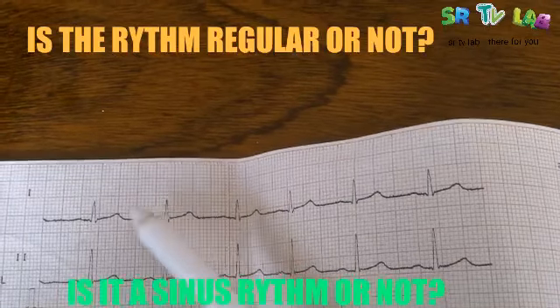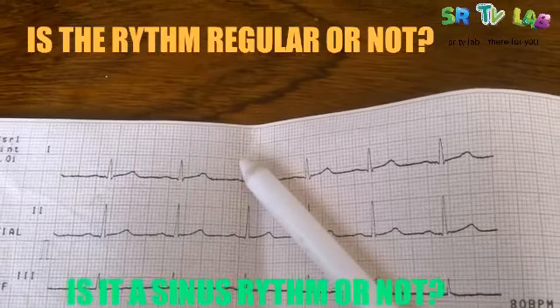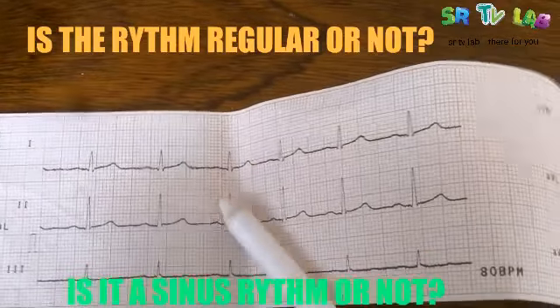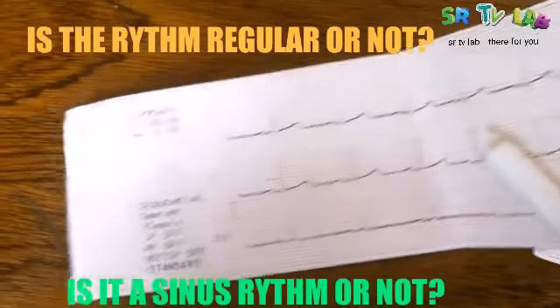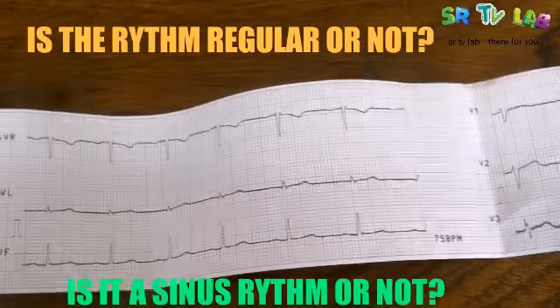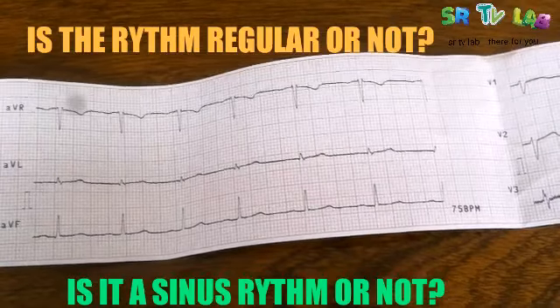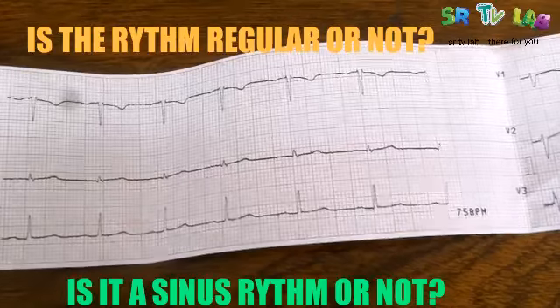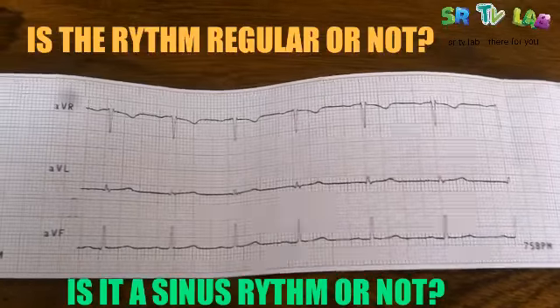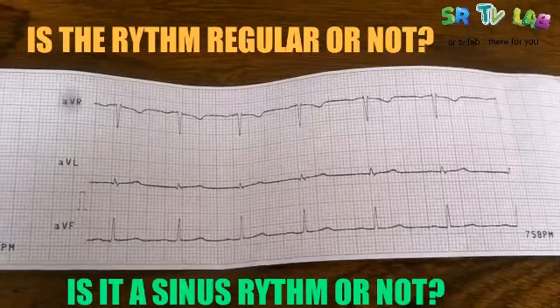Good. So the distance between these 2 adjacent R waves is the same. Even here they are the same. Then let's go to the other leads. When you check aVR, aVL, and aVF, the interval between R waves is also the same, which means the cardiac rhythm of this person is regular. That's good.